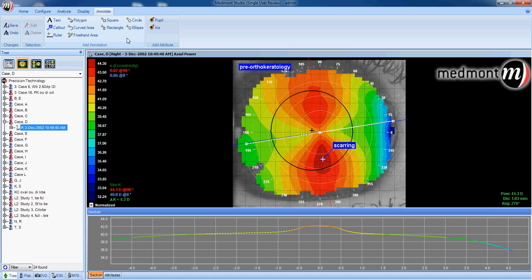and there are additional functions that you can use. For more information, refer to the Medmont manual for specific information on each one of the functions or each one of these windows. And this concludes video 5.